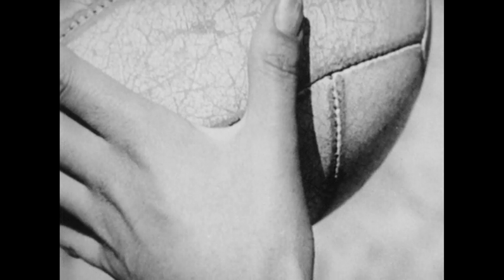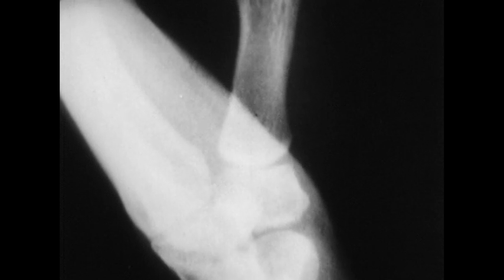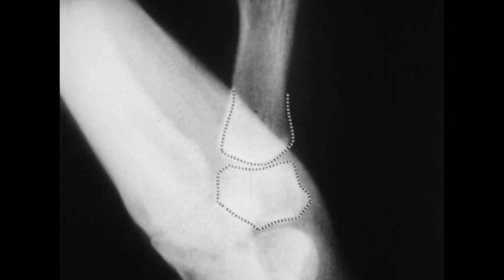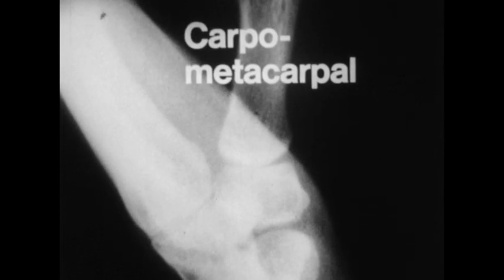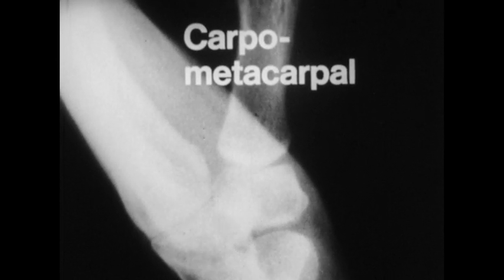A saddle joint, exemplified by the carpometacarpal joint of the thumb, has a concavo-convex surface fitting into a convexo-concave surface of the opposing bone. This allows biaxial motion. In a pivot joint, a cylindrical head of bone is held within a ring of bone or bone and ligament.